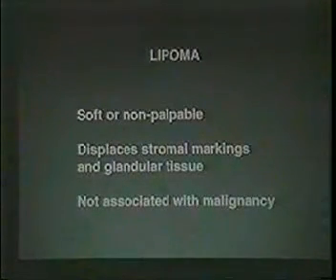It's not associated with malignancy. It's not premalignant. It doesn't look like what a liposarcoma looks like. And when we see this corresponding to a palpable mass, we can make a definitive diagnosis of lipoma.